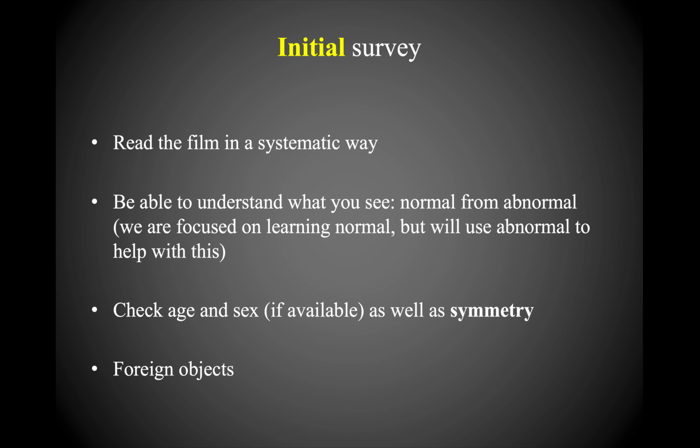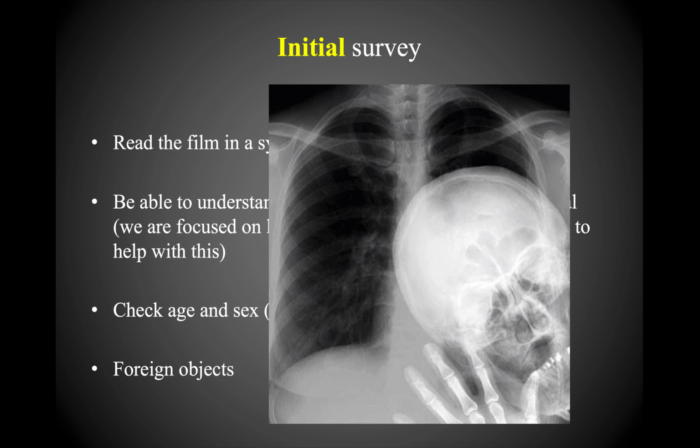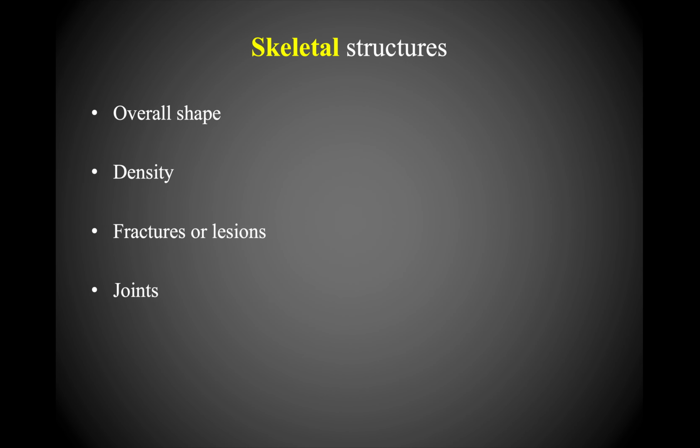And then again, you also want to keep in mind that foreign bodies, foreign objects are frequently observed in the chest. That could be external lines, it could be central catheters placed into the heart through the great vessels. It could be bullets, knives, etc. So there's many different foreign objects that can appear that you want to make sure that you consider. Or somebody can get in the way when you're taking your x-ray.